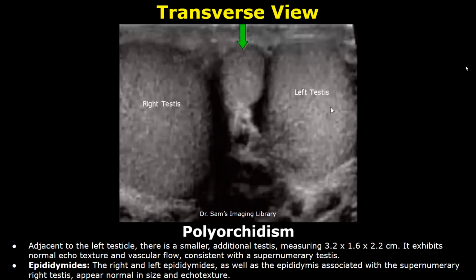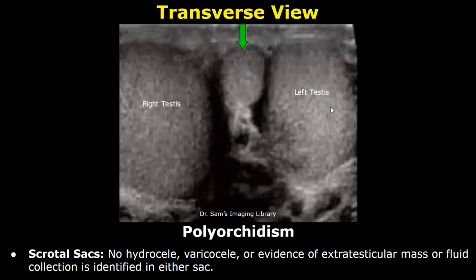And after that, you can write about the appearances of the epididymides. In this case, they were normal. No hydrocele, varicocele, or evidence of extratesticular mass or fluid collection is identified in either scrotal sac.